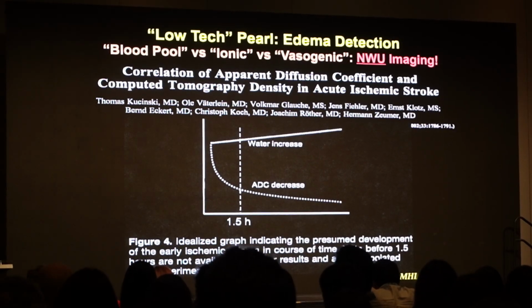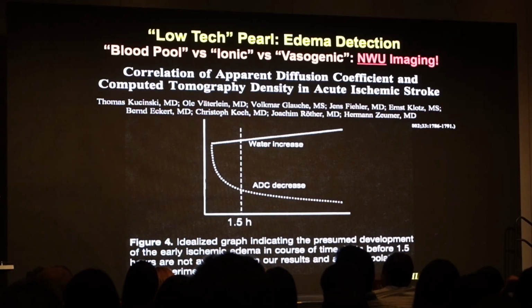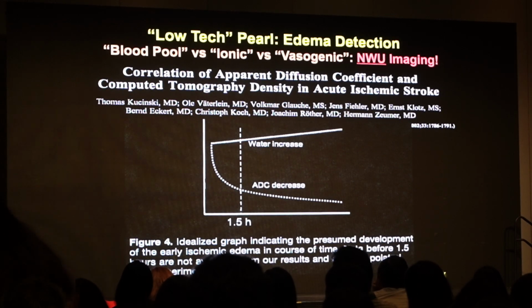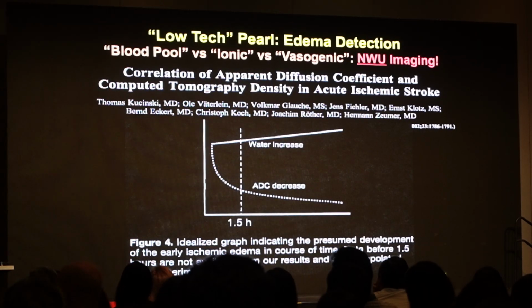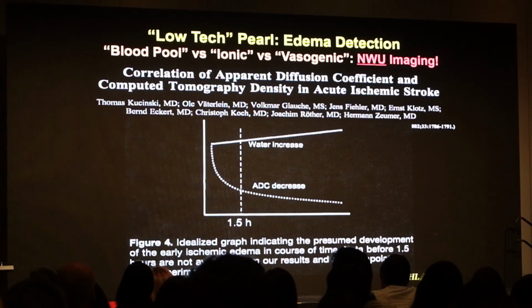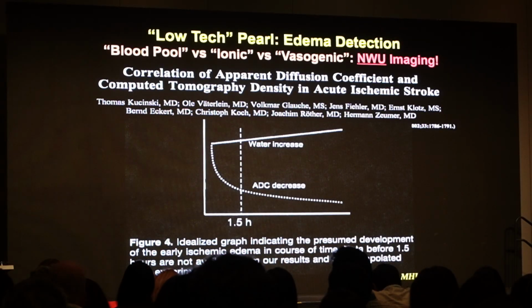It's actually not all water, because some of it is blood pool. Remember I said that you could put a cursor on the aorta and read the hematocrit. If you take gray matter or white matter plus the hematocrit, that actually increases the density. If you have an occlusion and the blood isn't reaching there, there is some subtle low attenuation that is not from edema. It is just from the fact that there's an occlusion and the blood isn't getting there.